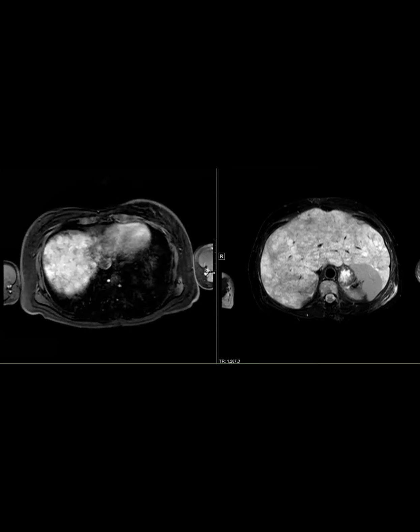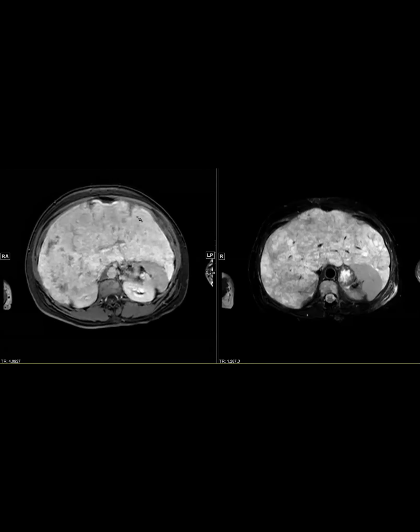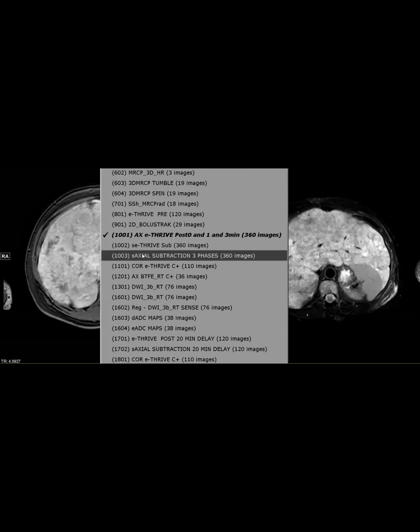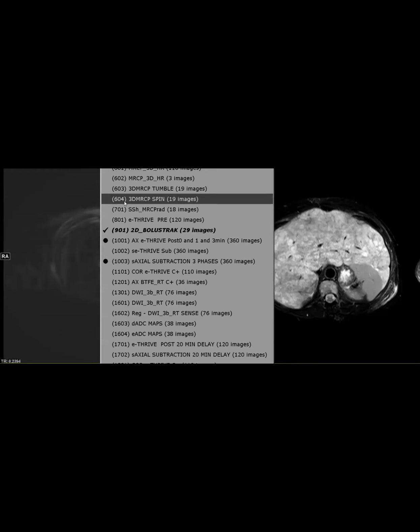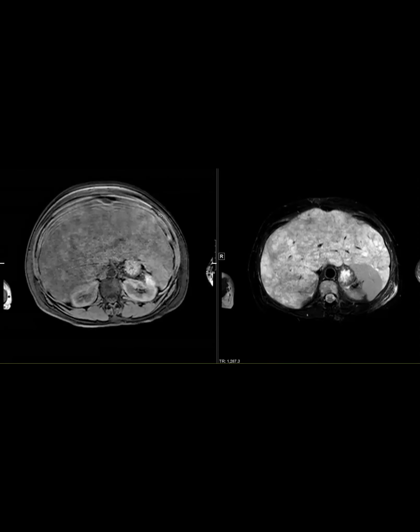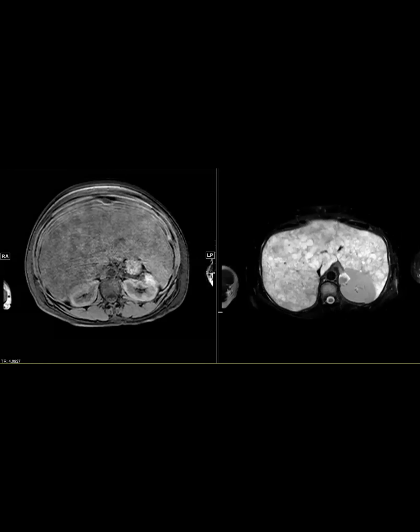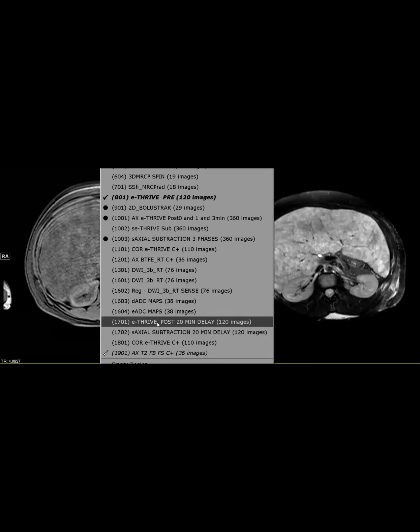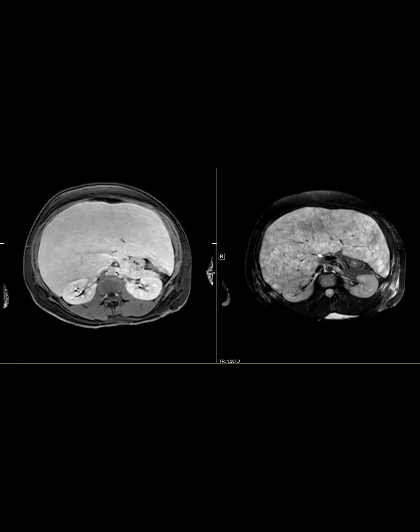The patient actually ended up having a liver transplant, and on the path, I've never seen this before. She basically had no normal liver. It was just all replaced by these masses, which are like a hemangiomatoid-like situation. She was not discovered incidentally, but after this she rapidly deteriorated and ended up requiring liver transplant because her liver function just went away. On the imaging there's really no normal liver left, and the path said 100% of liver parenchyma is replaced by these.